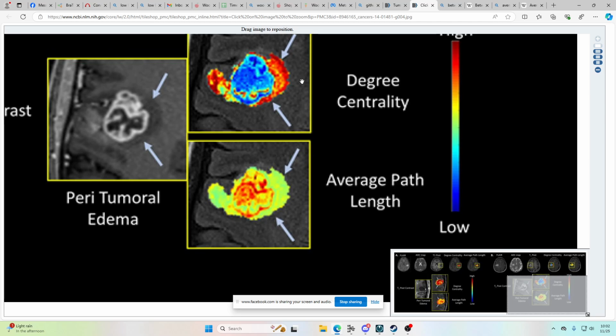You can consider the tumor's lineage tree as a graph on the cellular level, but also at the macroscopic voxel level, where the microenvironment of each voxel contains a mixture of different cancer cells.